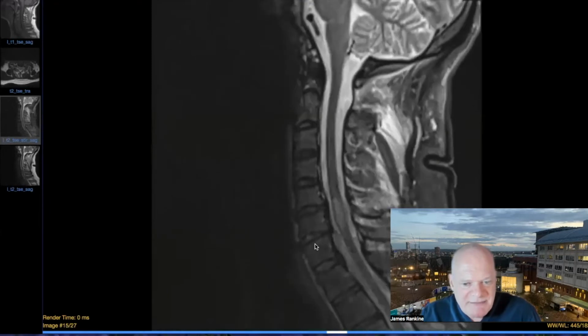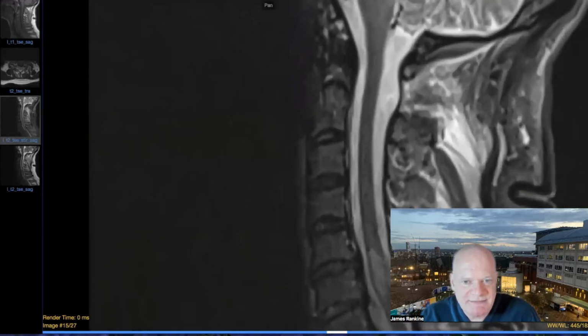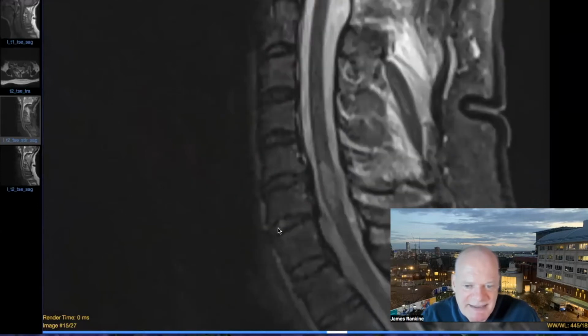And it can be very, very difficult to see the hyperextension avulsion, which is why we always want to have CT and MRI, but here it is, it's this little cleavage plane going in here with slight disruption of the anterior fibers of the disc space. So at the time of the injury, this has opened up. All of this part of the spine here has driven back and caused this cord injury here. So that's a classic hyperextension.